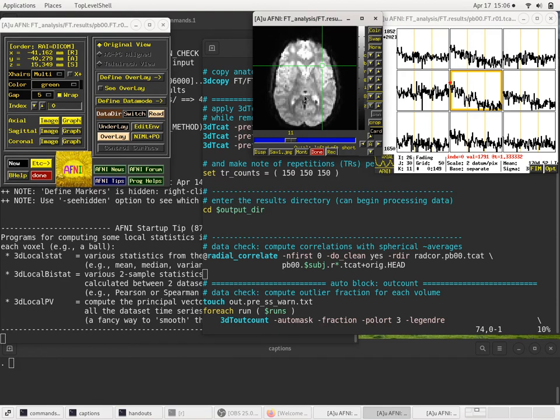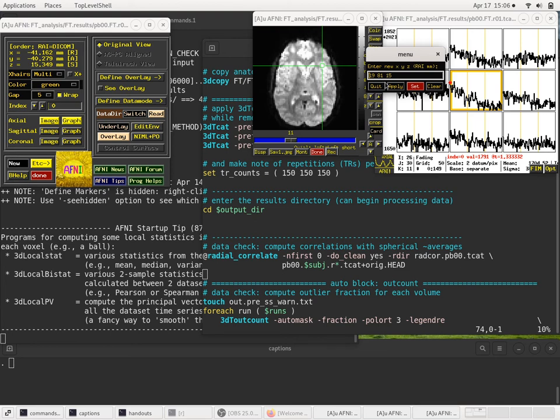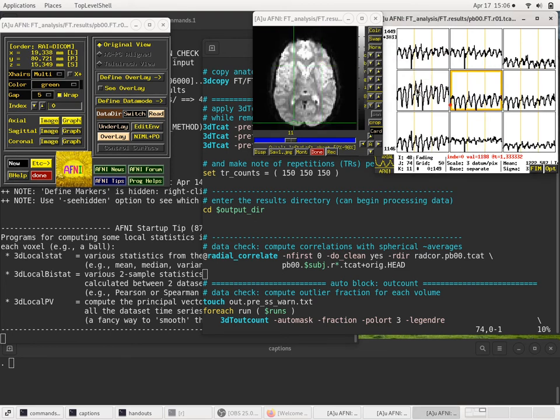Anyway, let's go back to our voxel of interest. I'll right click again and jump to XYZ. It still has the coordinates saved. Fantastic. So you notice that even at this current voxel, I see the apparently enormous signal change here, but there isn't even any major motion spike. So we're probably fairly in the middle of the gray matter here, at least relative to how the motion occurred.